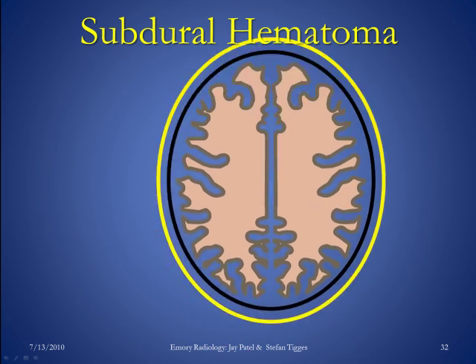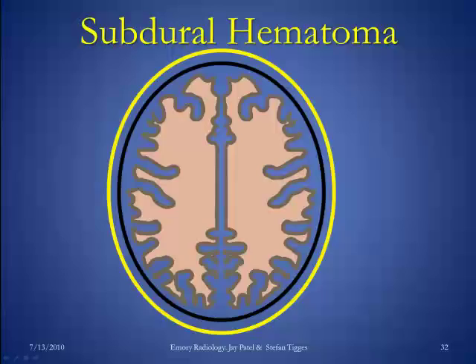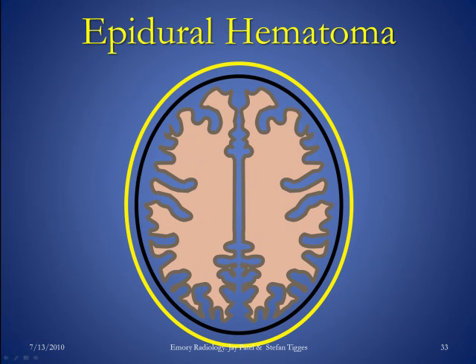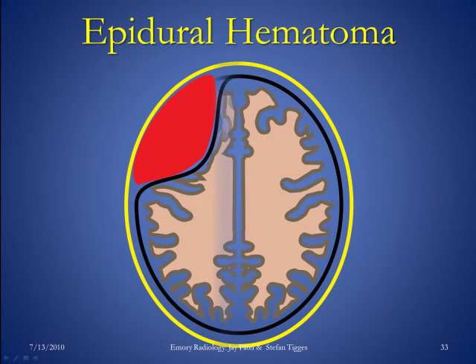This is a subdural hematoma occurring because of shaking of the brain. And here we've developed blood in a crescentic collection. If it's in mixed ages, you have to consider non-accidental trauma. Epidural hematoma: a baseball hits the head or a punch to the head, and they develop an arterial injury. It looks more lenticular in shape. Look for the right to left midline shift or any signs of herniation or abnormal mentation. Notify neurosurgery.